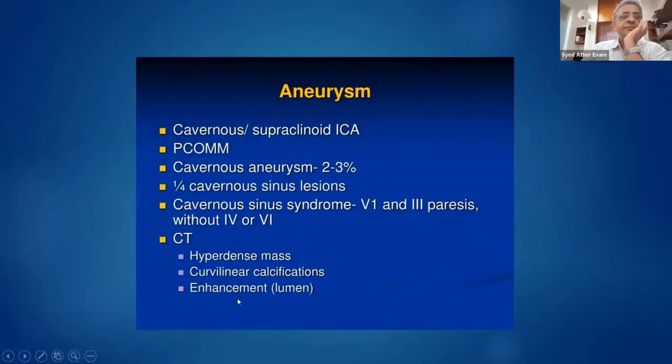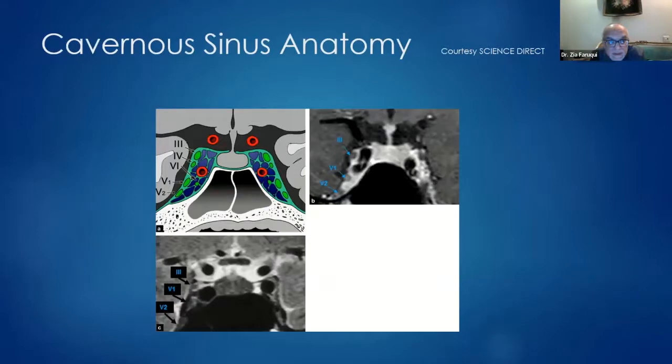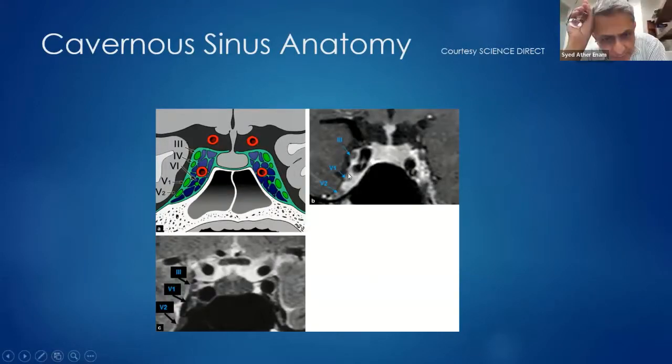Was it labeled wrongly? Was that the MRI? Yes. This is V1, where it was written V1, sorry, V1 was written.